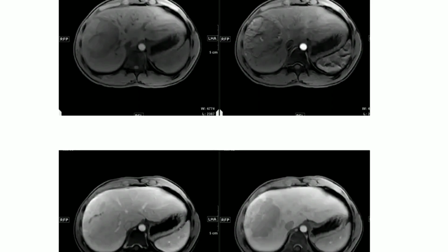We always say that if this FNH scar enhances in the delayed phase, fibrolamellar scar typically does not enhance, but not necessarily. We always have a certain percentage of variant pattern. One of them is that in fibrolamellar HCC, the type of scar is a fibrous scar, and in a small percentage, it might show enhancement.